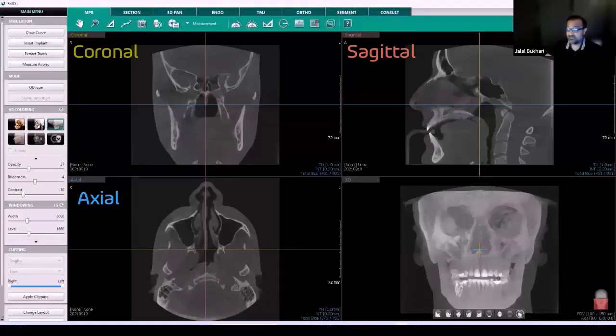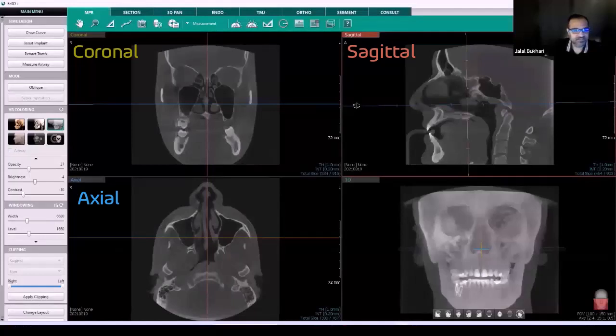The next thing I want to do is to make sure that the structures are oriented for symmetry. How do we do that? Let's take a look. So let's try orienting a scan. What I mean by orientation is I'm trying to show symmetry within the different planes. Now note how I go to this blue line and change its direction.